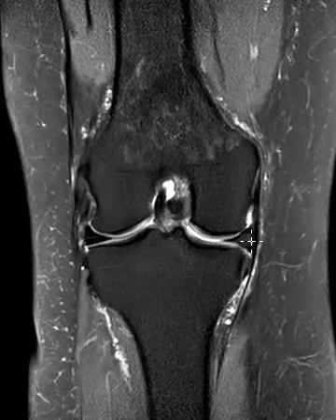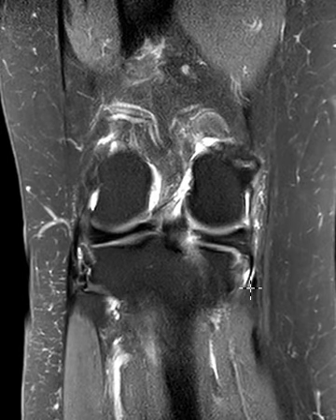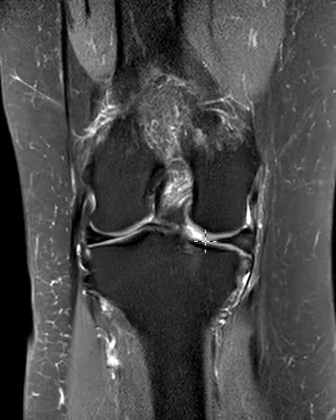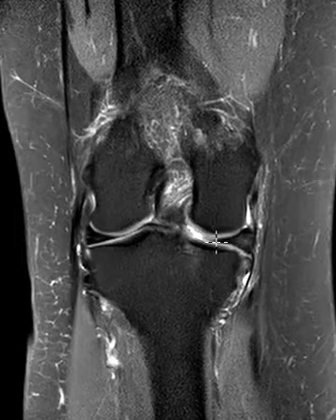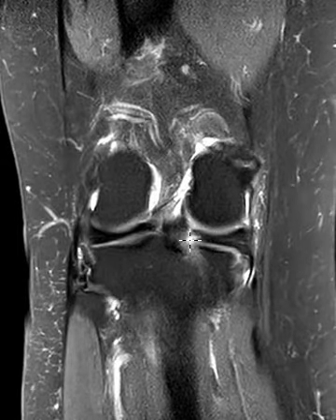So we're going to go backwards and see if it's true. And there it is right there. We see this bright band, which is fluid, right at the posterior horn root junction. So this is a radial tear of the meniscus root or posterior horn root junction, and it's allowing the meniscus to drift outwards because there's loss of hoop stress. The radial fibers are torn, and that's it. So radial tear of meniscus root.